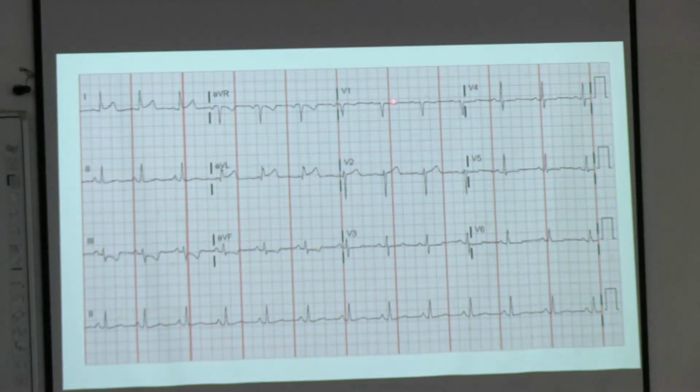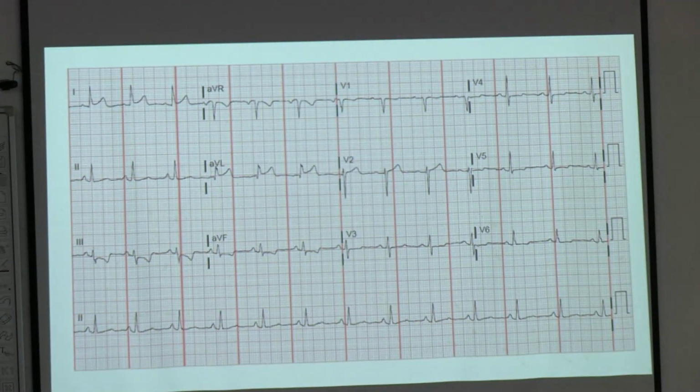Anyway, you see from V1, see V1, V2, just check the QRS complex. In lead V1, you see the QRS complex is majority downwards. Clear? In V2 also it is downwards. V3 upward, downward, more or less the same, right? In V4 upward deflection is more than the downward deflection, and in V5 it is predominantly upward deflection. V6 it is predominantly upward deflection, right?